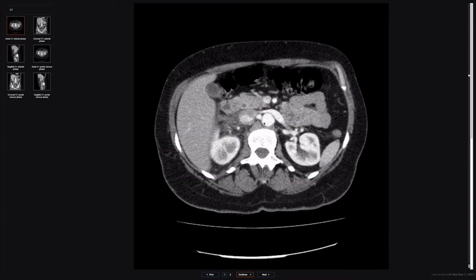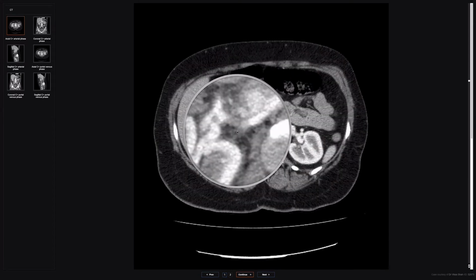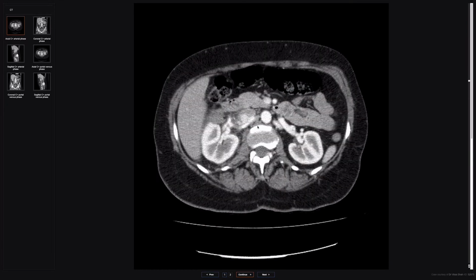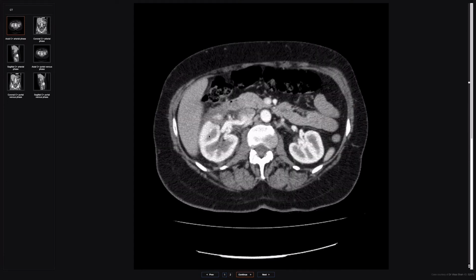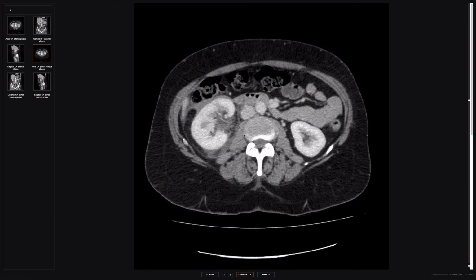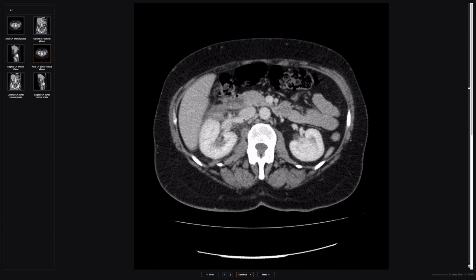Something else you look at is the renal artery. Check that there's no renal avulsion. Okay, so if there's a motor vehicle accident, deceleration forces, then you can get renal artery avulsion. And in that case, the renal parenchyma would not be enhancing at all. And then we go to the portovenous phase where we're going to look at the renal vein, really importantly. Check that there's no avulsion or thrombus there.